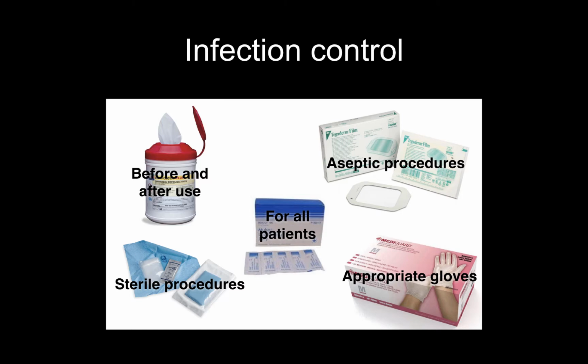Anytime a procedure is being performed, appropriate gloves should be used, but I would personally recommend using gloves every time you do ultrasound, even when you're not doing a procedure, just to prevent some of that sticky ultrasound gel from getting onto your hands.